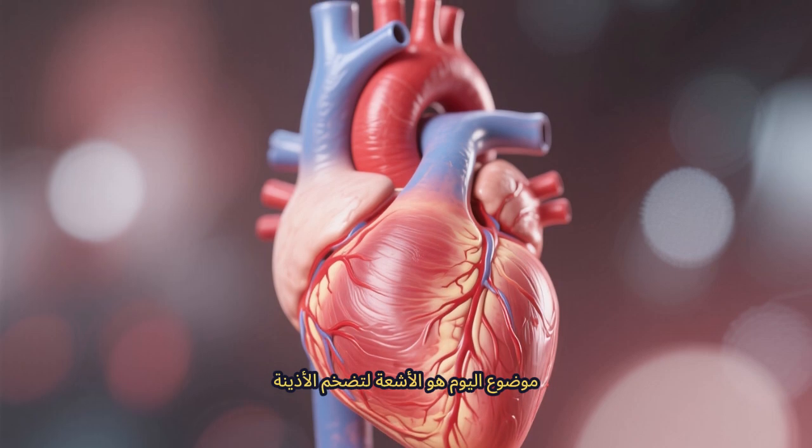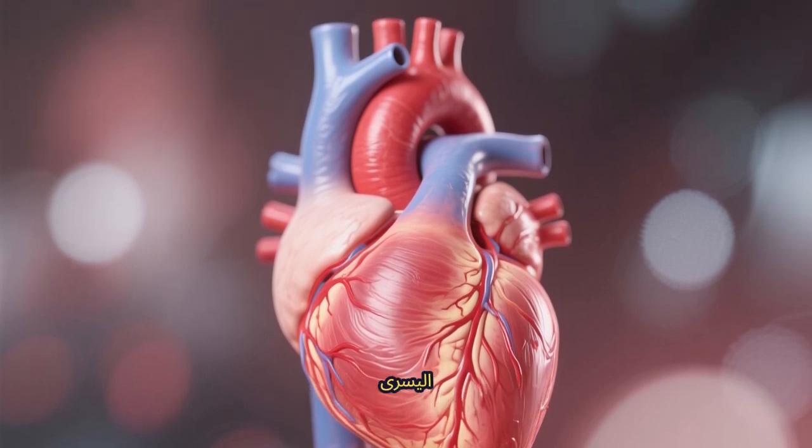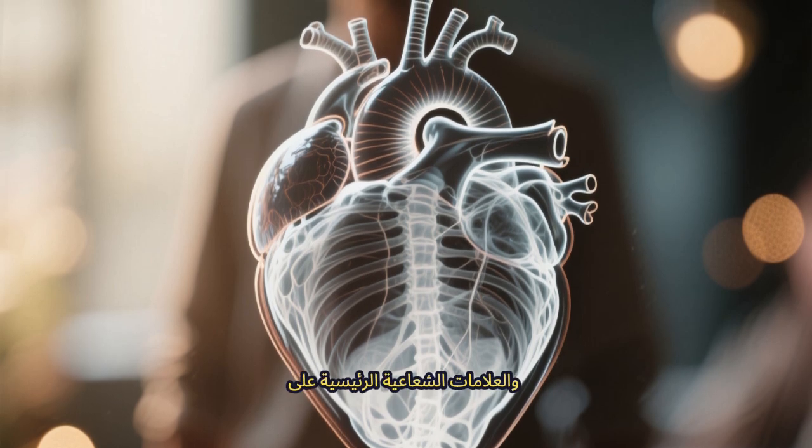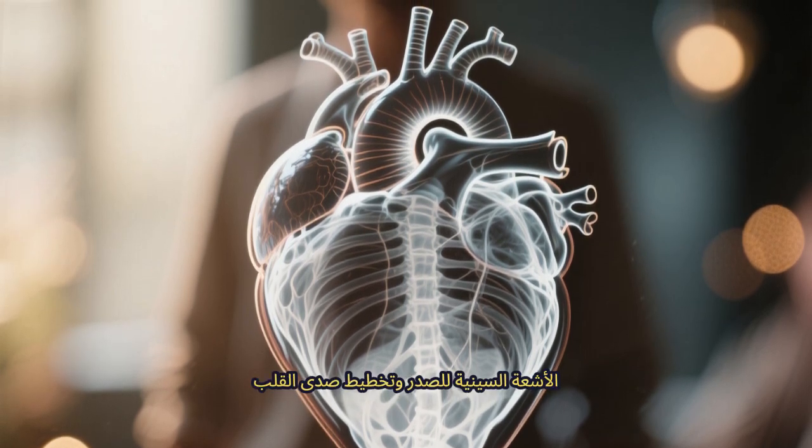Today's topic is radiology of left atrial enlargement. We'll explore its anatomy, causes, pathophysiology, and the key imaging signs on chest X-ray and echocardiography.